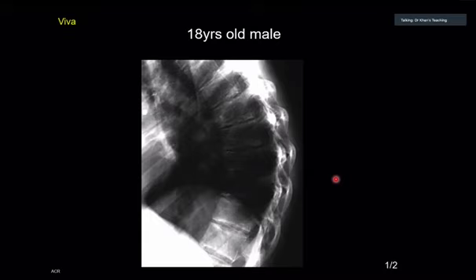Okay, forget about bone density because that is projectional. The density is fine. But look at the age of this patient. Anything comes to your mind? He's 18. I'm just trying to check the rest of the film. Right. Don't worry, there is nothing else in the film.